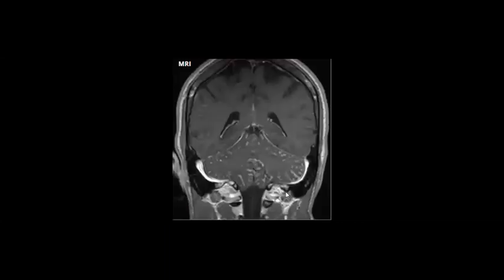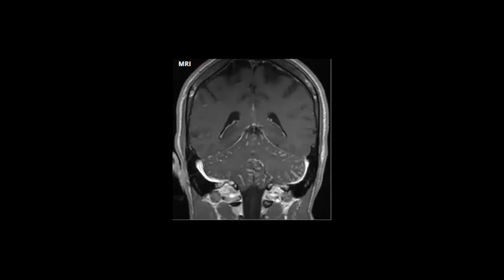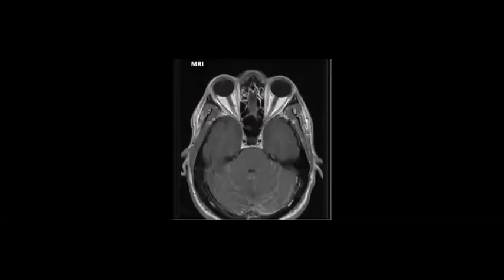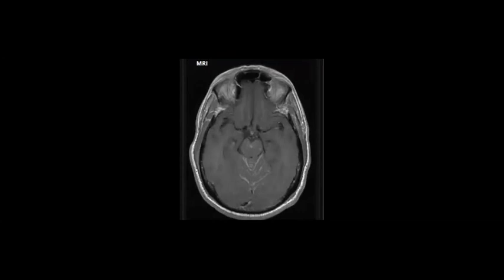This is a typical case they like to show you for the nodular leptomeningeal enhancement. Perfect. It could be carcinoma, and it could be inflammation like meningitis.